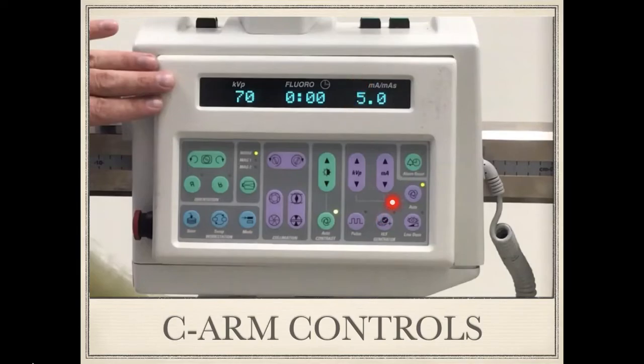In the center is the high level fluoro button, HLF. This is used when you want very fine or good quality images. Generally, people use this when they are taking a final shot for storing images.